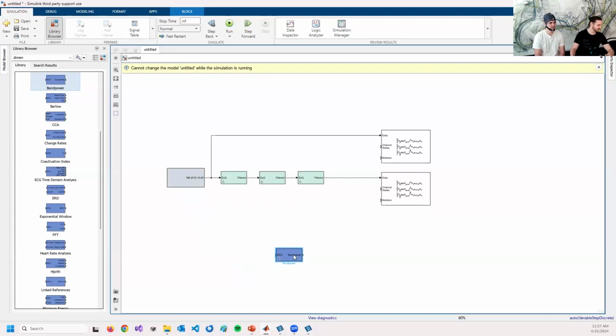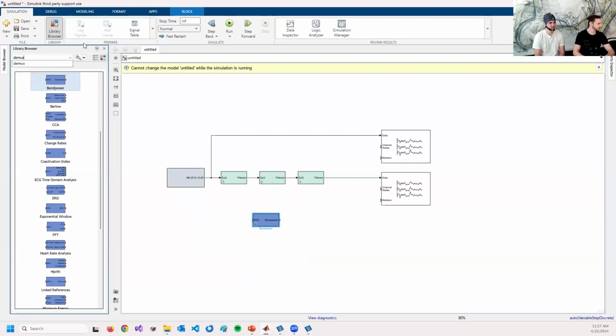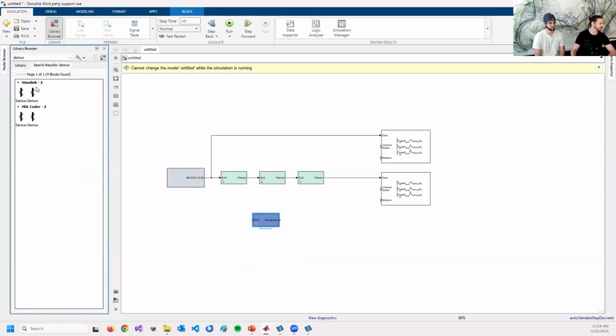And I'd just like to check the band power for different frequency bands for one single channel. Therefore, I'm going to split the 8 channels from the BCI and just look at one channel.